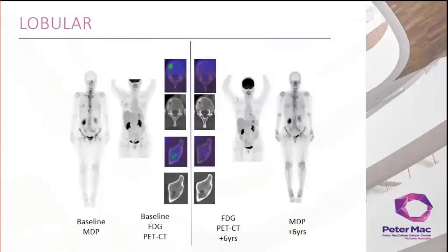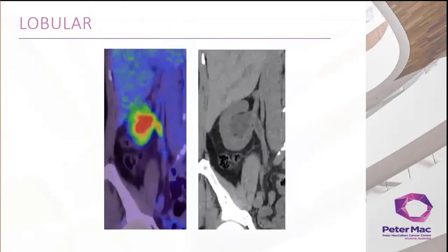So again, did we answer everything we needed on the FDG? You've probably noticed that on the bone scan in particular, you can see that there was dilatation of the collecting system of the right kidney. No avid cause was demonstrated on the FDG.